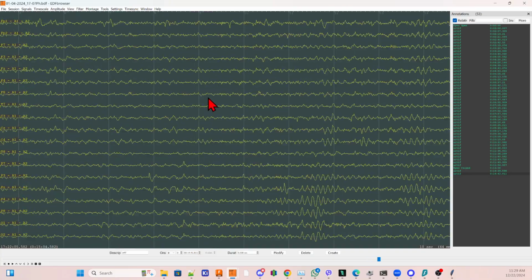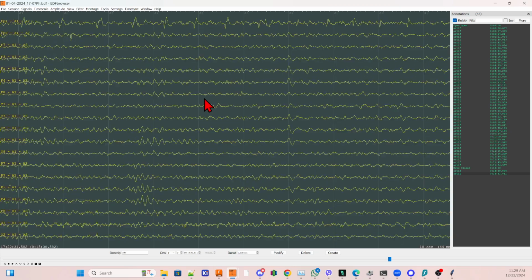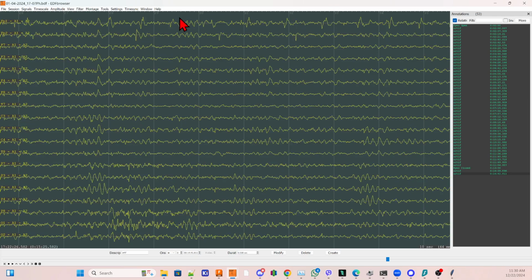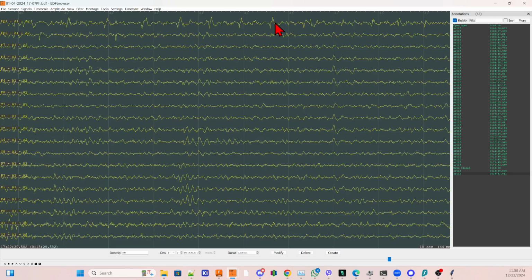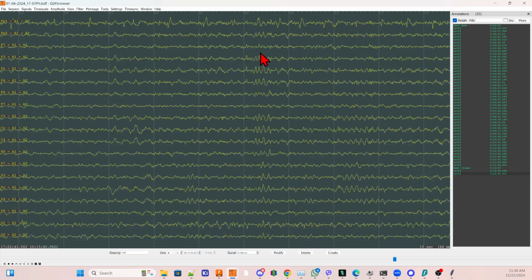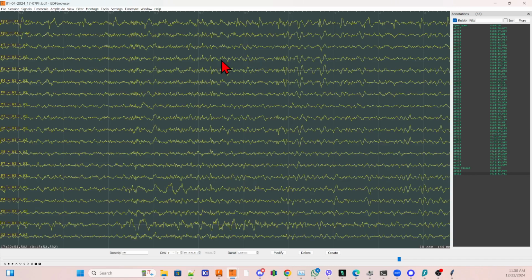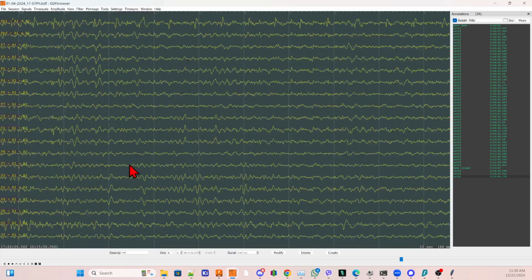And moving forwards in time. This is clearly a heartbeat. We're recording their forehead here. It might have a little like throbbing or something. I'm going to leave it. Little shifting here. You see this one over here. O1 is having a bit of a shift or something in the electrode. I'm going to mark it.